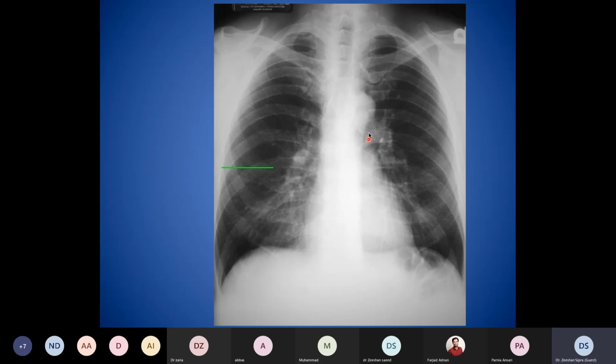This is also producing a knuckle, and this distance between the aortic knuckle and the pulmonary knuckle is called the AP window. This actually helps a lot in checking mediastinal lymphadenopathy. Usually, lymph nodes fill up this concavity, and this becomes straightened like a straight left heart border. That suggests that either the pulmonary trunk has increased in size, filling up the space, or more commonly, there is a lymph node producing a shadow and filling up the space.